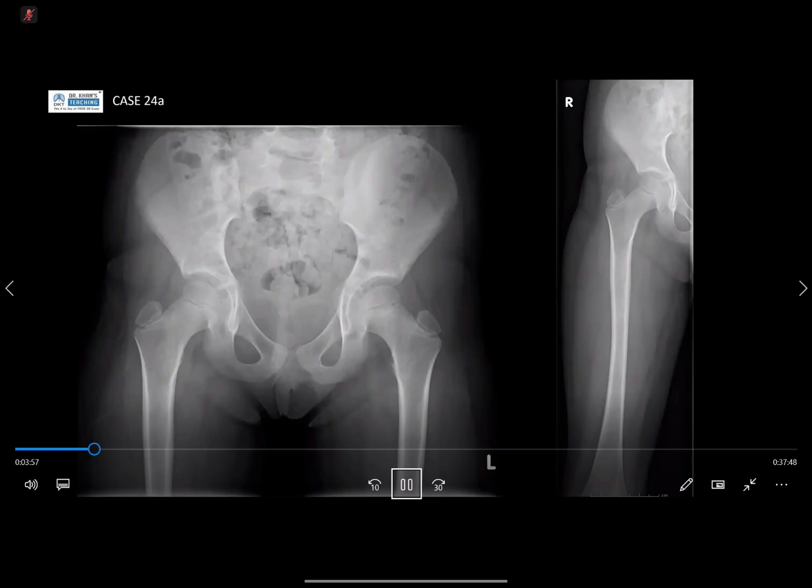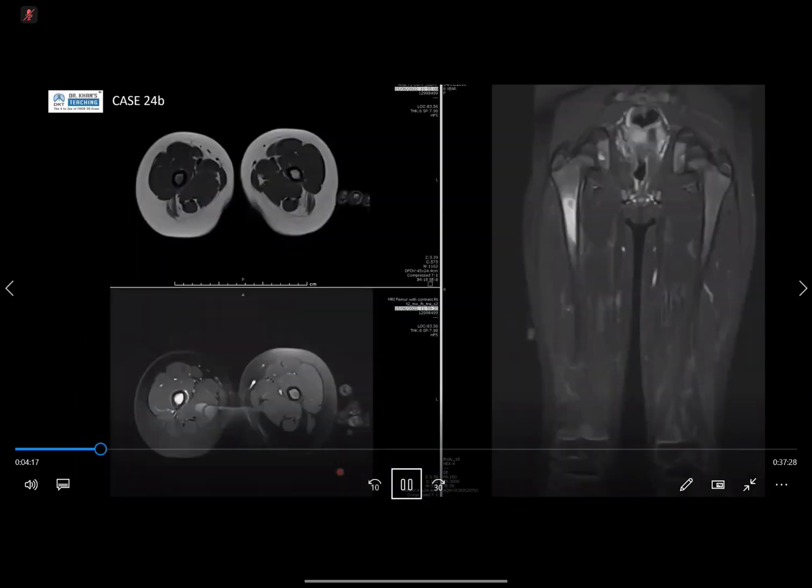Yeah, exactly, so you're right. There is periosteal reaction, and it's quite thin. You can almost say, is it lamellated? But when you look at the other side, not so convincing. I would say it's more convincing here. Now you decide to do a bit more because the soft tissues are quite okay, but I'm not sure the bone density is okay. Let's do more imaging. So you've done more imaging.